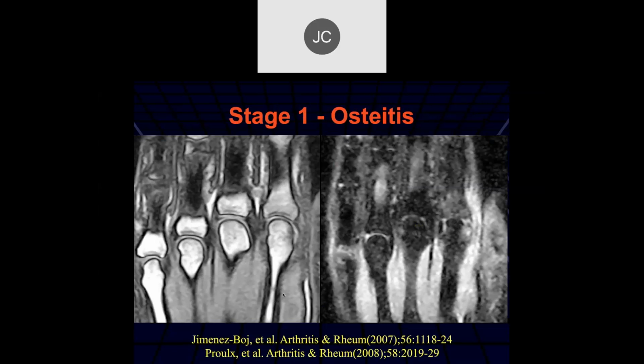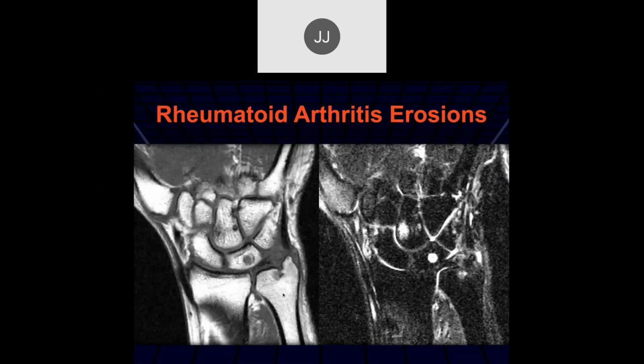John, were you going to say something? I did. I mentioned that looks like a cystic lesion. Yeah, but this is actually filled with inflammatory tissue. There's quite a bit of fluid in rheumatoid joints.